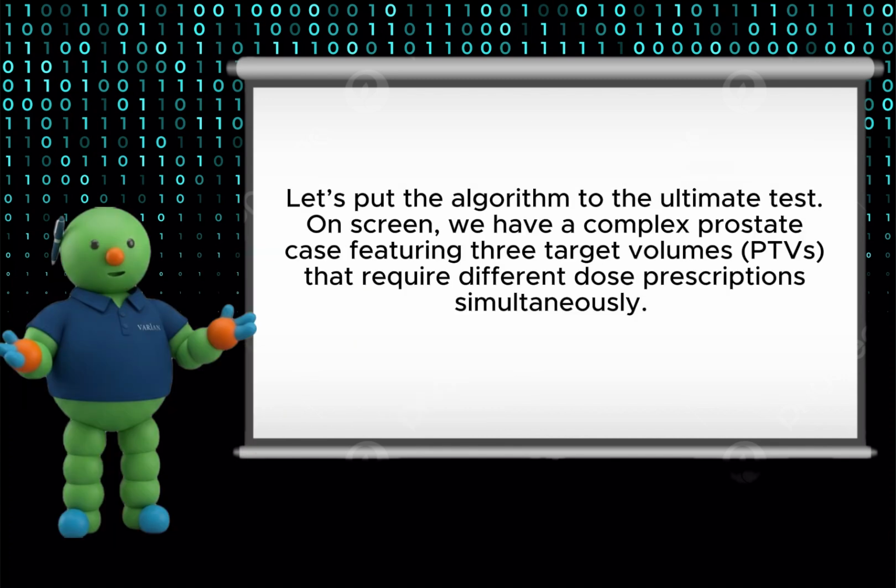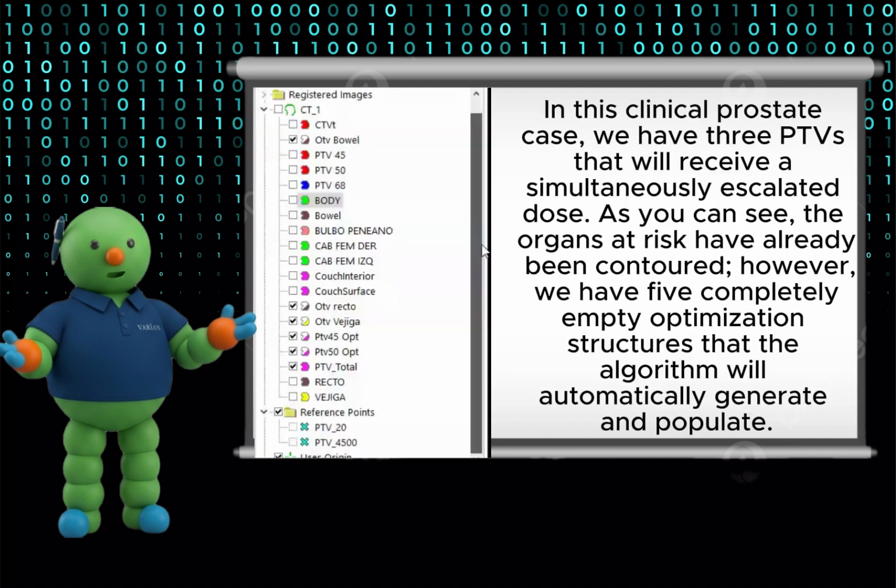Let's put the algorithm to the ultimate test. On screen, we have a complex prostate case featuring 3 target volumes, PTVs, that require different dose prescriptions simultaneously. In this clinical prostate case, we have 3 PTVs that will receive a simultaneously escalated dose.